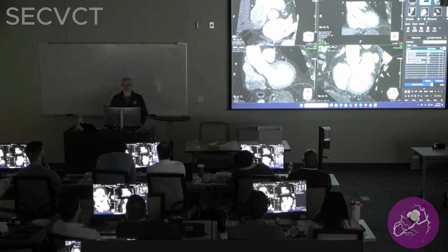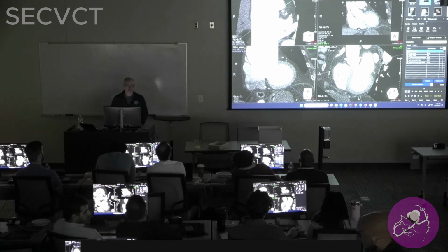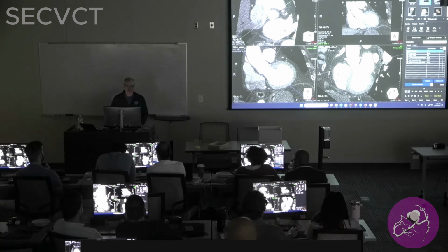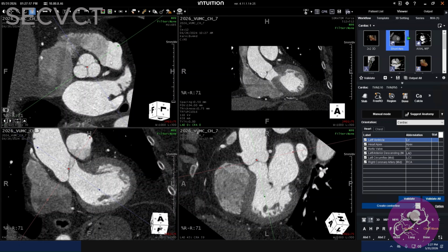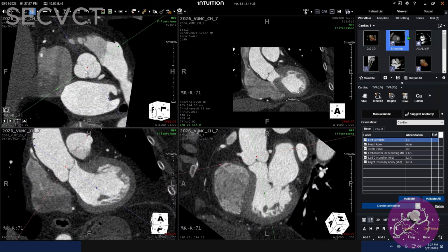Now, I want to show you how to manually measure a round or elliptical object. If you go up here, there is what's called the distance pair, or Control D. So if you click that, then you click here, you drag it, and voila, it measures it for you. That's pretty cool. So we'll go straight up. We want to do the mid-sinus diameters, right? So you go up and say, hey, this is about the mid-sinus right here.